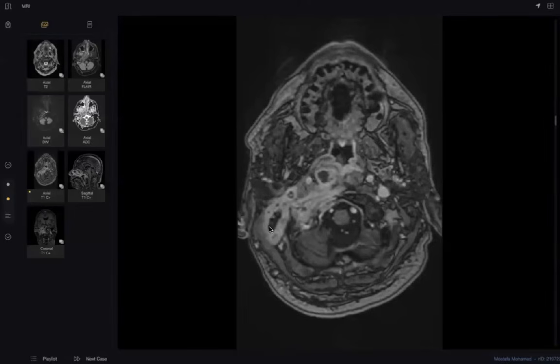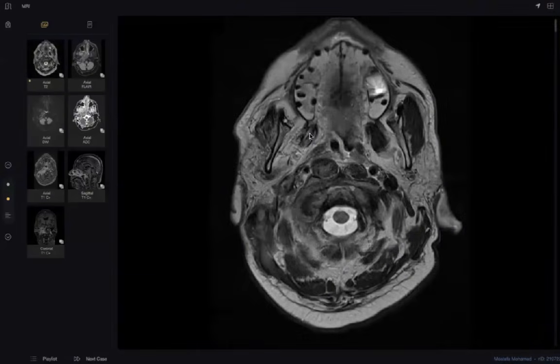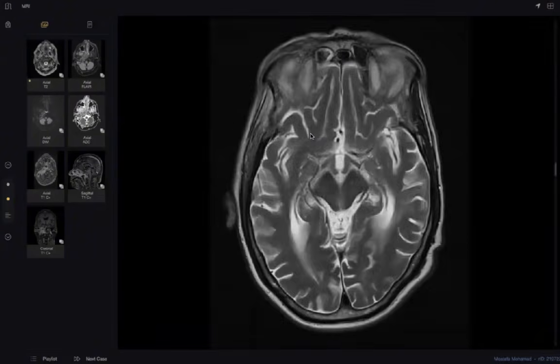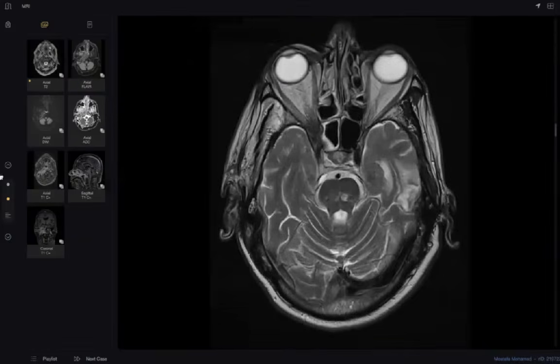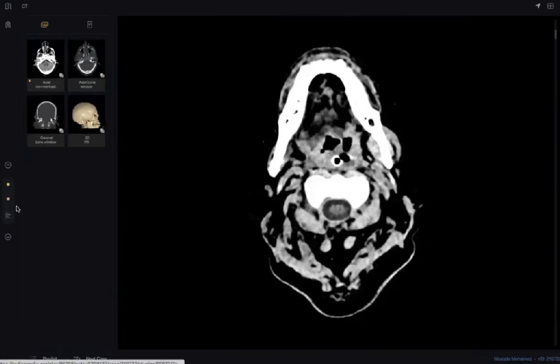The carotid artery, I commented on it. See, this patient has an ET tube. You didn't talk about it at all. This is the ET tube. This means the patient is very critical.